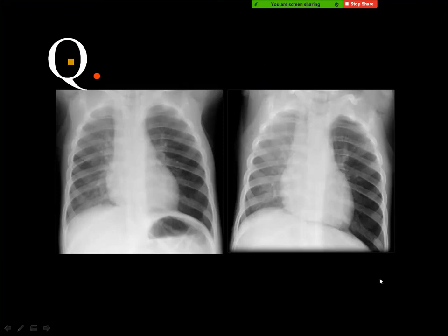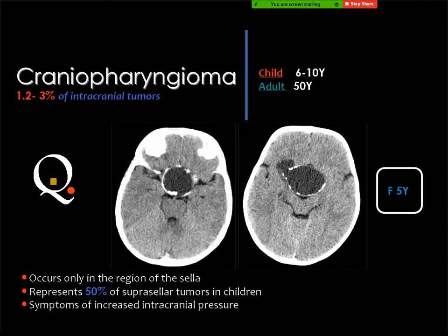Sir, regarding this region, how can we differentiate it from suprasellar dermoid? Yes, dermoid contains fat, and intracranially you should see the fat, and you depend on the presence of fat to diagnose the lesion. But in the mouth floor, for example, and in certain locations like the orbit, you do not need to see fat to diagnose dermoid cyst. But intracranially, you should see fat to diagnose dermoid cyst. This is a very important issue.